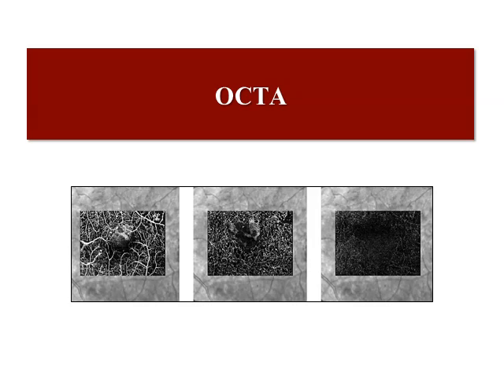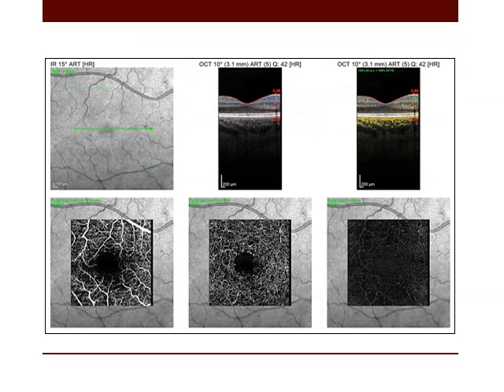What about OCT angiography in diabetic patients? In OCT angiography, what happened? What happened is we took an en face image for the fundus, then a special device was added to detect motion in the retinal blood vessels. From this motion, we can draw an artificial image for the retinal blood vessels. So OCT angiography is based on the en face image and detection of motion within the blood vessels of this en face image.